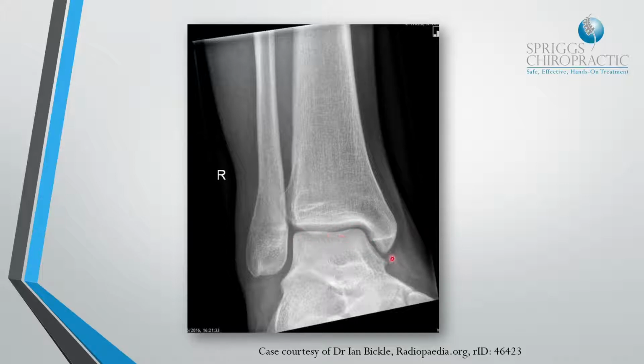This is normal radiographic anatomy, so I'm doing my best to not give the game away. There we go, just so that again I can prove I know my anatomy.